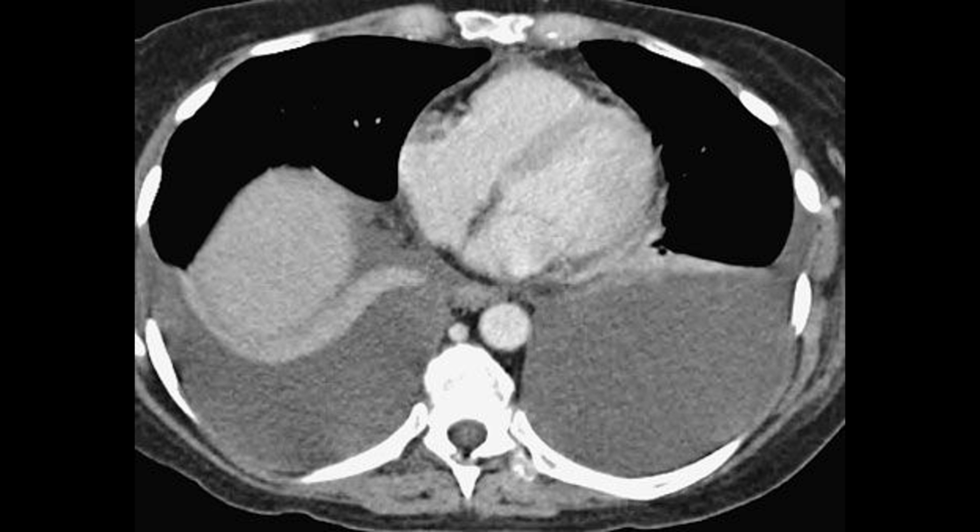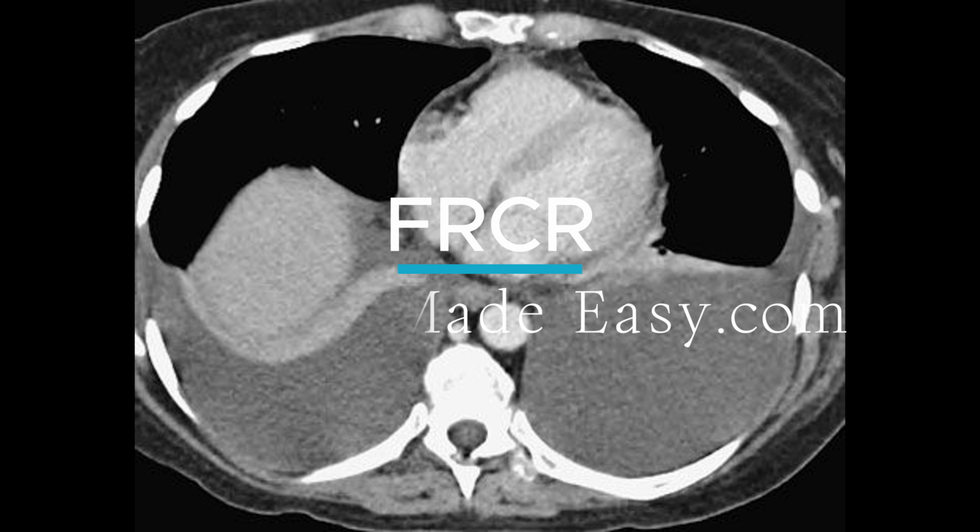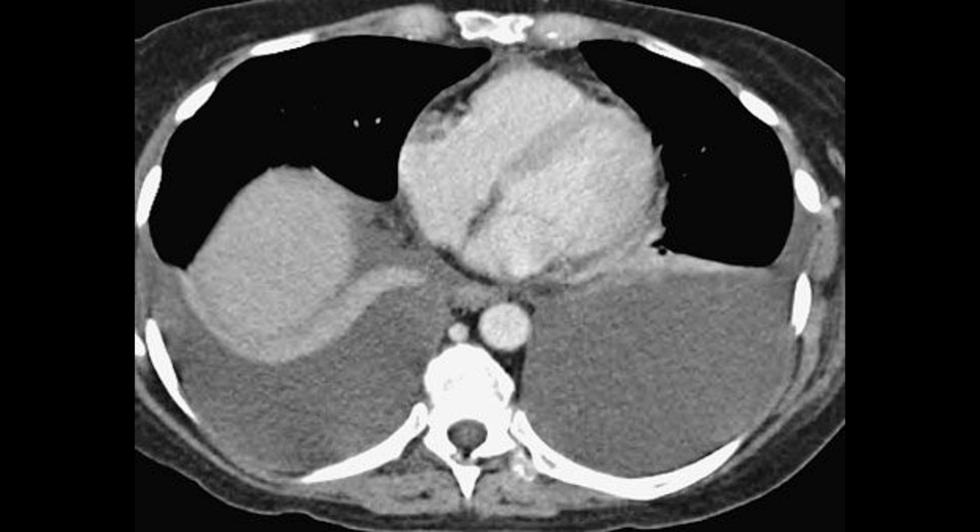In summary, this case demonstrates bilateral subpulmonic pleural effusions in a patient with omental carcinomatosis, recognized by the increased stomach-to-lung distance, lateral displacement of the diaphragmatic peak, and blunting of the posterior sulci. This pattern highlights the importance of carefully assessing diaphragmatic contours to avoid missing subtle but clinically significant pleural fluid.